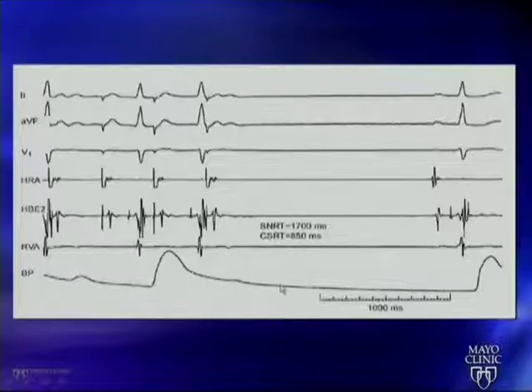So once you're able to recognize suprahisian and infrahisian block, you can pretty much, if you like, just tune out and you're done with this preparation for this part of the boards. But just in case, you can follow along for a couple more slides. So here, notice what's happening here. Here there's 2 things happening. I'll give you a second to look at it.